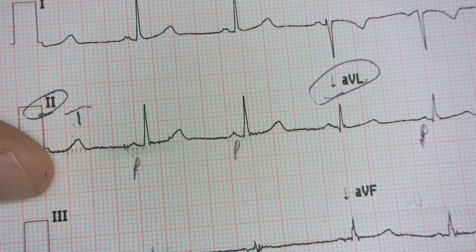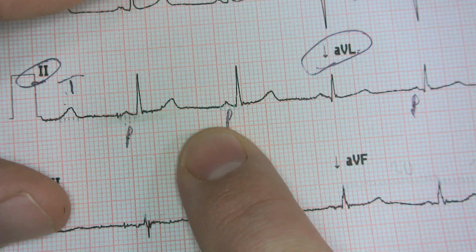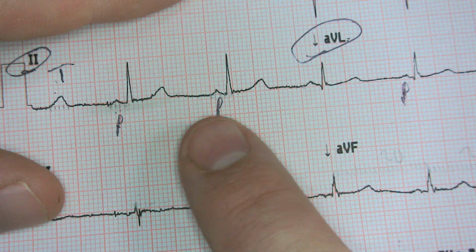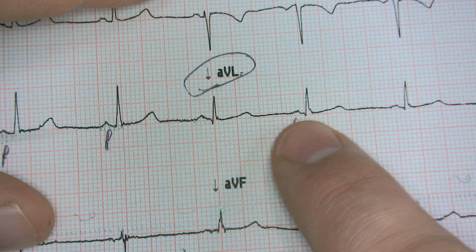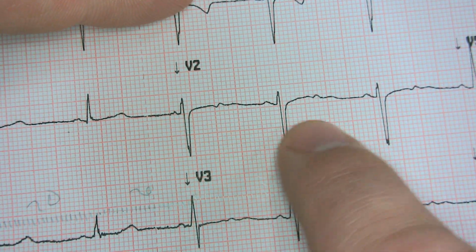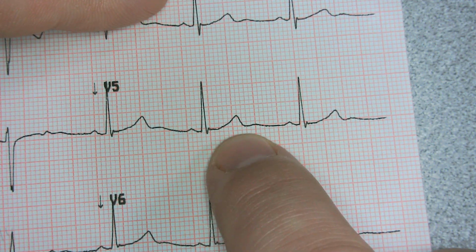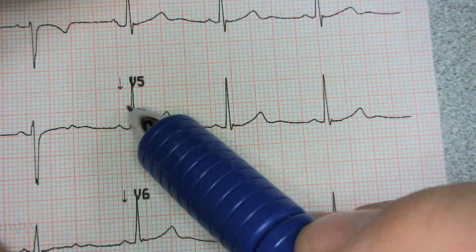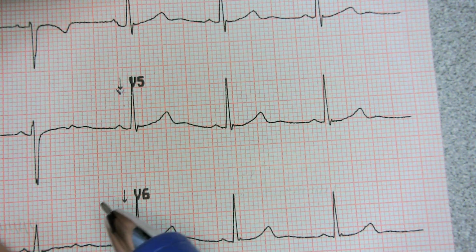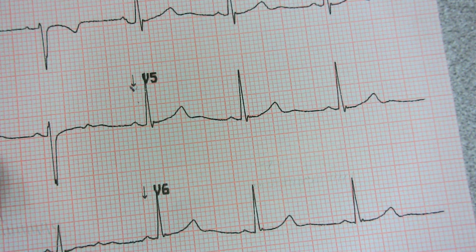All right. So next thing what we have right here, our P waves right here are upright uniform in lead 2. Unfortunately, lead 2 isn't very long. So if you want to see if I'm going to do a better job, we can look at AVL, they're uniform. When we look in V2 over here, they're uniform. When we look at V5, they're uniform over here, right? Because this mark right here is showing you, hey, this is exactly when my viewpoint changed. And so aside from any viewpoint changes, we're seeing that our P waves are uniform.